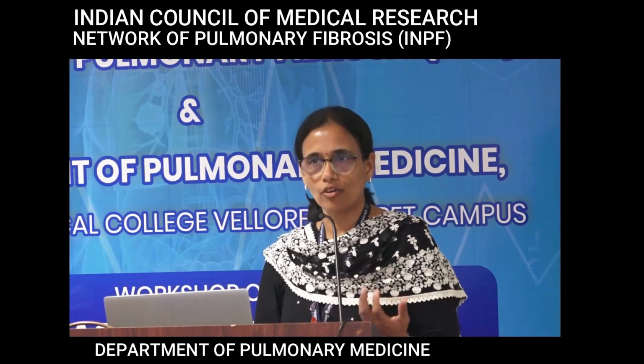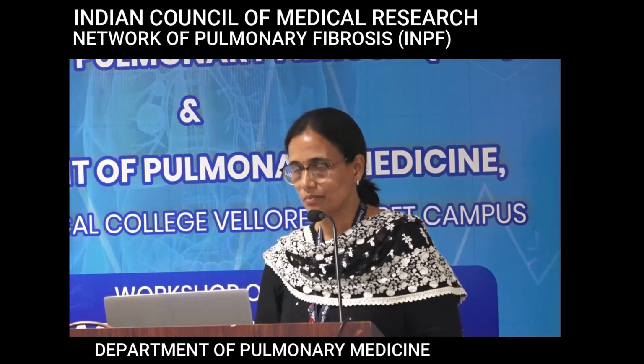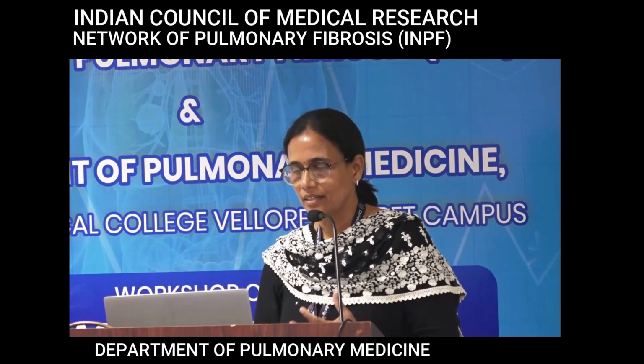Honeycombing is the hallmark of the UIP pattern. So what is honeycombing? It is multiple layers of cysts which are kind of uniform in size. They share their walls, and the wall is slightly thick. This is a typical appearance of honeycombing.